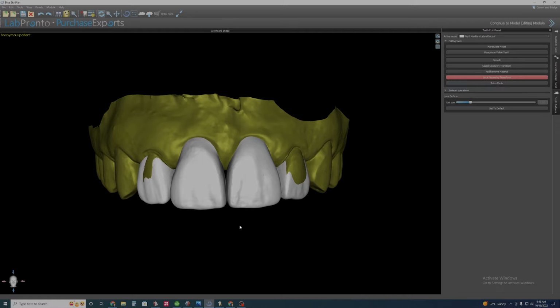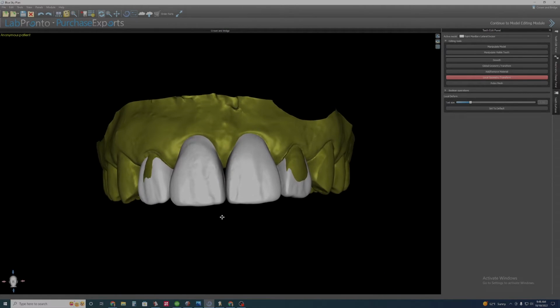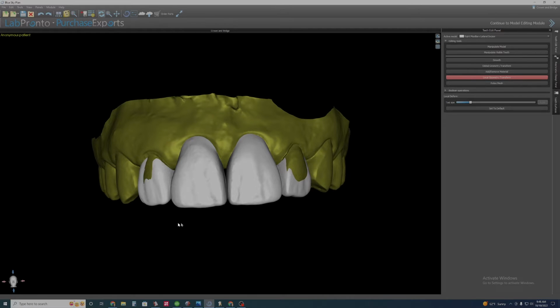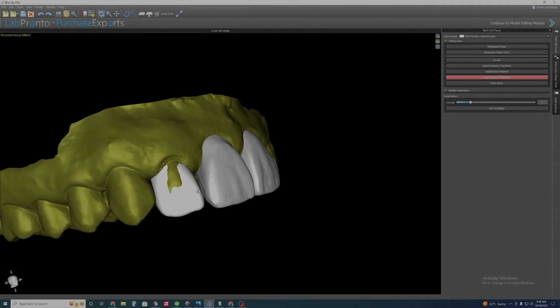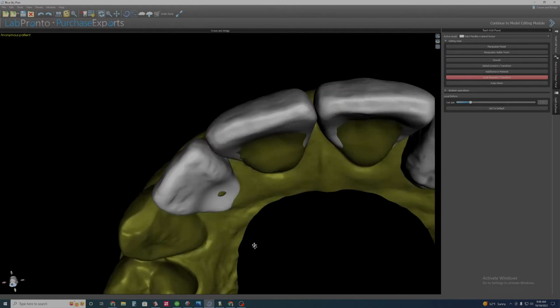Alright, the 8-9 position looks pretty good to me. Still not 100% happy with the way that the shape of the tooth is so dramatic from the gum line to the incisal edge. But I'm going to work on the laterals and try to get those positioned a little bit better. Once I have everything in relatively good position, especially in relation to the margins and the shape, then I will come back and start making all the fine-tune adjustments to what I want shape-wise.